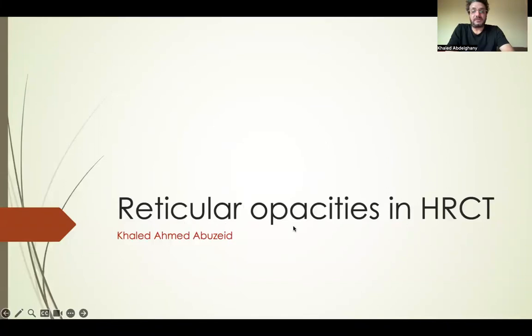The topic which I will talk about is the reticular opacities in HRCT. In the literature, reticular opacities are divided into bronchovascular interstitium, interlobular interstitium, and intralobular interstitium.